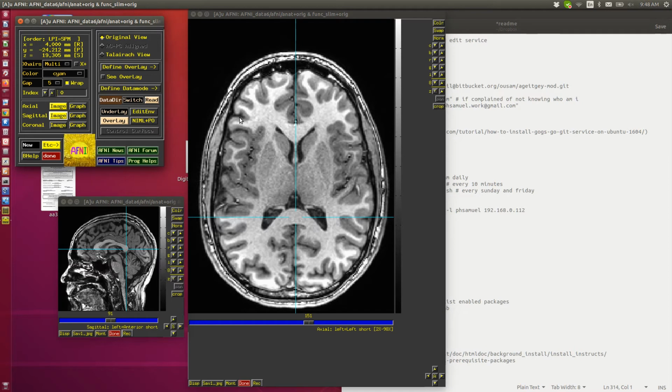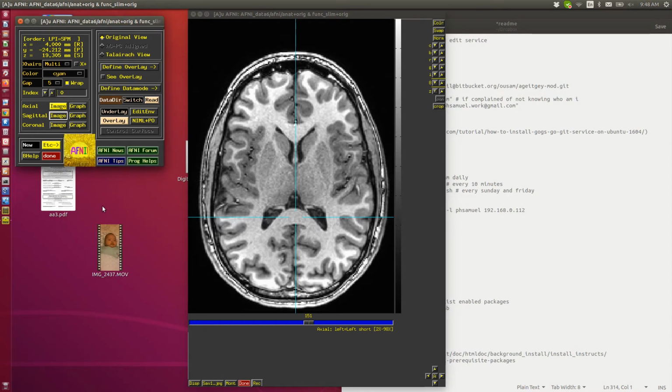I'm going to close the sagittal image again, and let's go to some questions to make you actually think here, as opposed to just consuming this entertaining monologue. Here's an image window. How could you change the brightness of this? I'll give you a hint. There are some buttons along the right side of the image viewer. I call this whole window the image viewer.